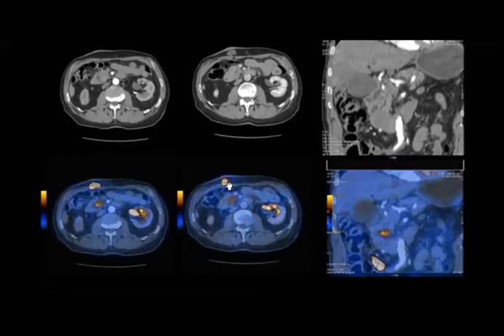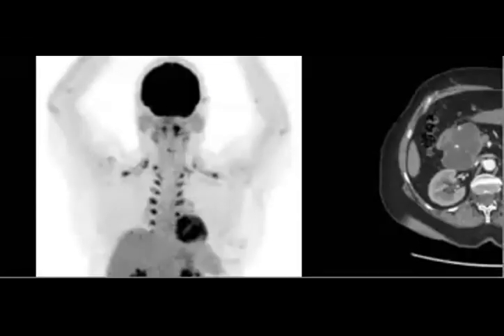Do you know what they do after radical cystectomy, an operation to maintain the urinary excretion? Do you know what they are doing after the cystectomy? So diversion. Perfect, Sarah. Welcome, Sarah. You always come at the right time and give us the good answer. Yeah, so they make the diversion. So expect that it could be the pouch for diversion. Sure, if you have the coronal image or the MIP image, it will be easier for you to see it. But yeah, just think about it. Yeah, conduit. Perfect. Conduit, doc. Perfect. Nice.